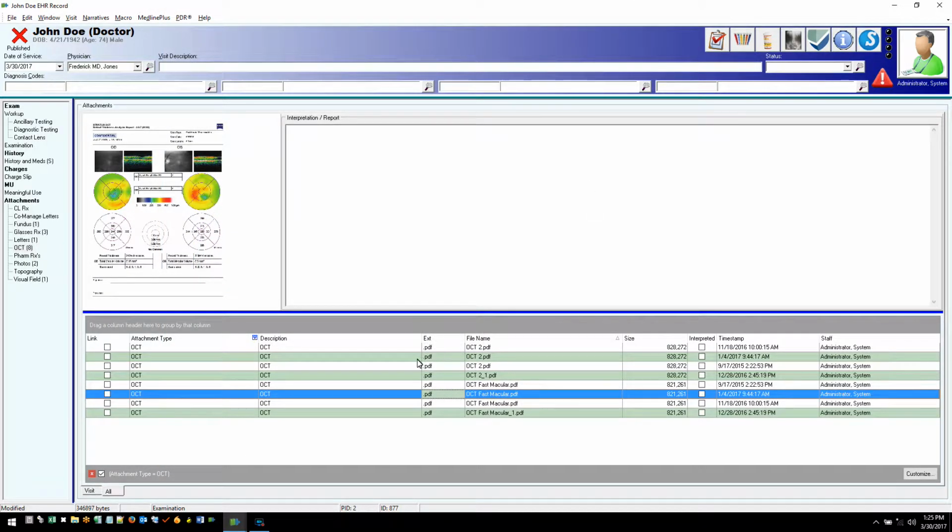The significant portion of that is, let's say I have a JPEG and it's just opening up in a photo viewer, but I want to change it so it opens up in a photo editor instead so that I can draw on it. Then it's very easy to do that, and you can draw on the photo and save it again.